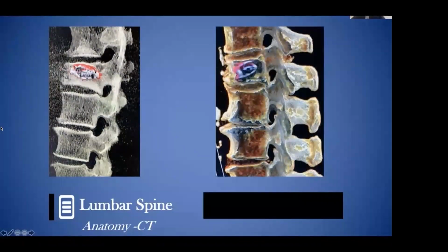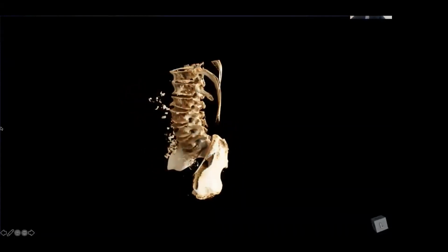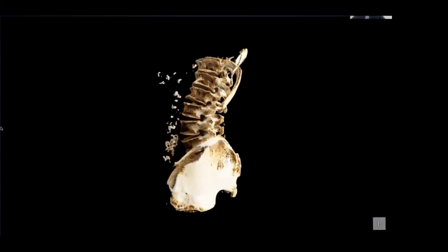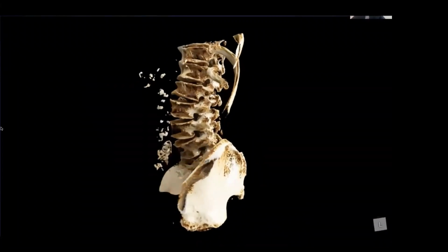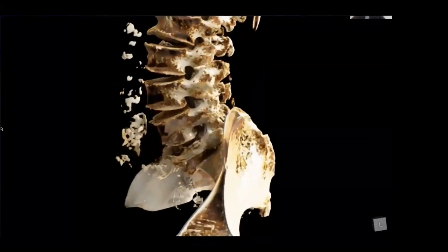This is just an example, and this is one of the cases I was going to show you guys at the end, of augmenting a vertebral body with an implant and cement. Just showing you that again, we can go from the outer layers from a whole data set to depicting the 3D volume of the spine using this, in this case, using CT.